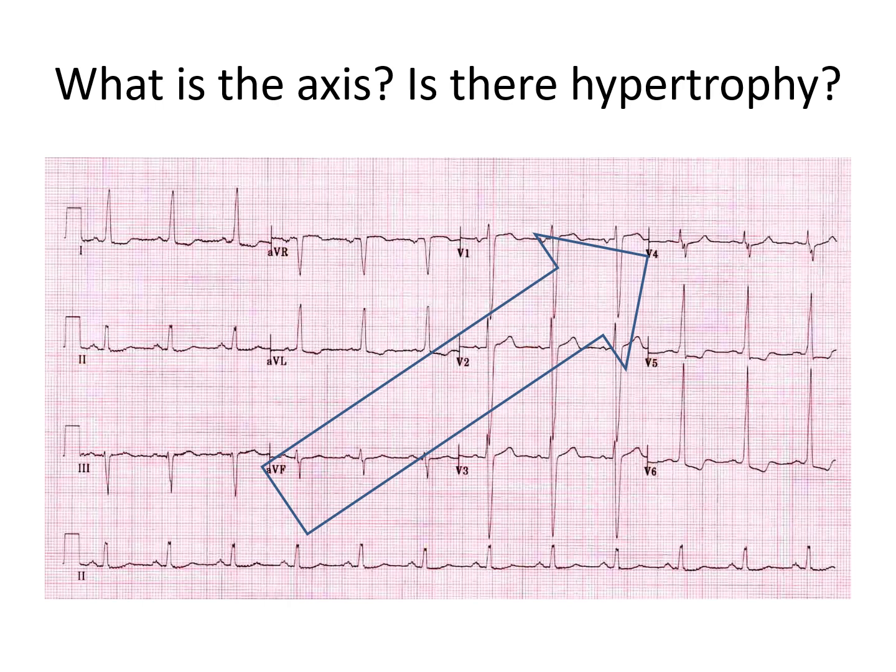And those leads would be 1, AVL, V5, and V6, and that's exactly what we see. Conversely, we would expect the rightwards looking leads like V1, V2, and V3 to be strongly negative. And that's exactly what we do see here. So you can memorize the formal criteria, but just understanding what's going on can give you a pretty clear picture of whether hypertrophy is present or not.